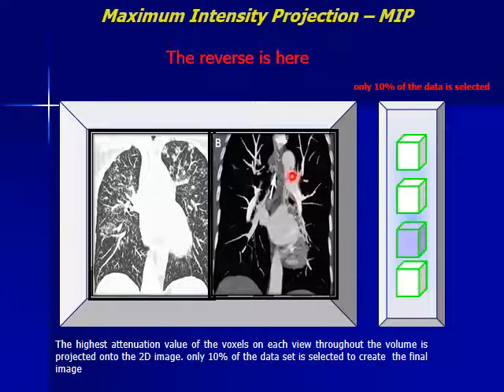Number one, it changes how the vessels are seen in the ordinary image as tubular structures. In soft tissue window, we can see bronchial arteries and pulmonary arteries as tubular branching structures. And in the lung window, it is very important to differentiate micronodules from the nearby vessels. Let us see.